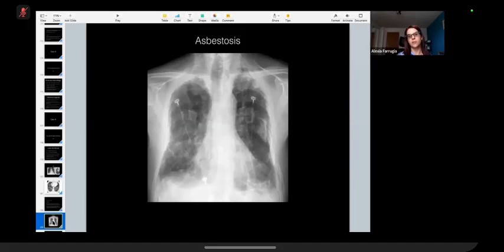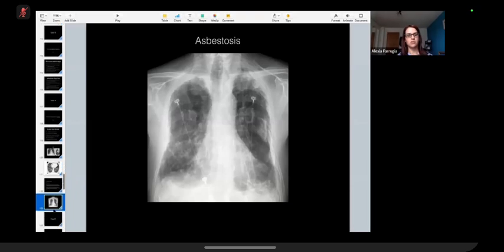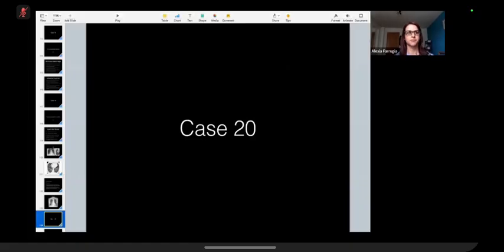And this is a chest X-ray of another patient with extensive bilateral pleural plaques, subdiaphragmatic as well. So he had asbestosis. So look for all these findings, because these would be important negatives. You can say things like, I cannot see evidence of calcified pleural plaques, which would suggest asbestosis. I can see a dilated esophagus with an air fluid level, which would point to this being part of scleroderma, just so that you can show the examiner your thought process.